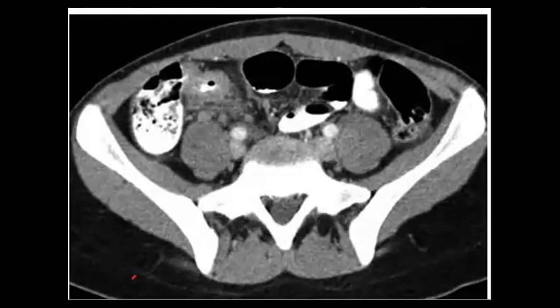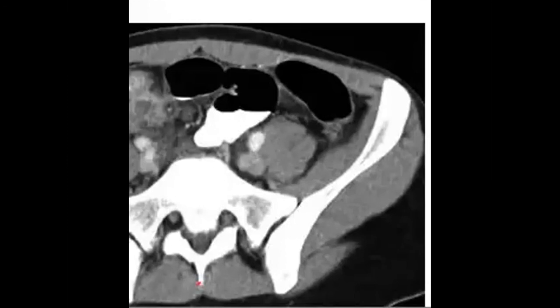I see a lot. And you will search for any lymphadenopathy. I mentioned that already you have something here. So okay, I agree with you, Huda. Nice. Fat stranding, Muayyad. Maybe it can be one of the differentials. It could be a mass. So I think now it is time to choose another image and see. Huda, I agree with you in the differential. I agree with Sarah again and you, a good differential.